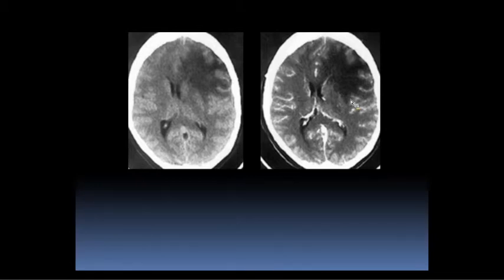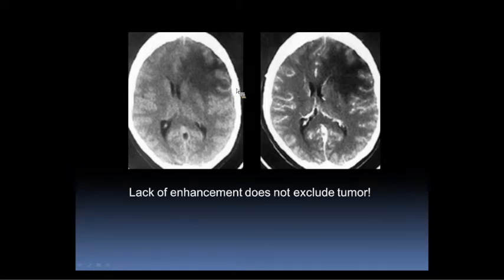So it's not going to be an abscess. It's not going to be a met. But can we say that there's not tumor here, and maybe this is just, should we reconsider that this is stroke? Well, we still have preservation of the gray-white. It's still a vasogenic edema pattern. So we really can't exclude tumor, because this could easily be a non-enhancing infiltrative low-grade glioma. High-grade gliomas like GBMs enhance, but low-grade gliomas can be just infiltrative and non-enhancing. So this is a low-grade glioma. And cerebritis could also look like this as well.